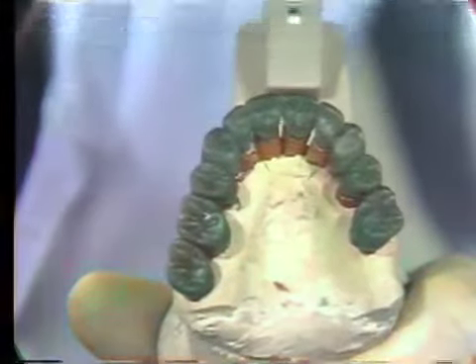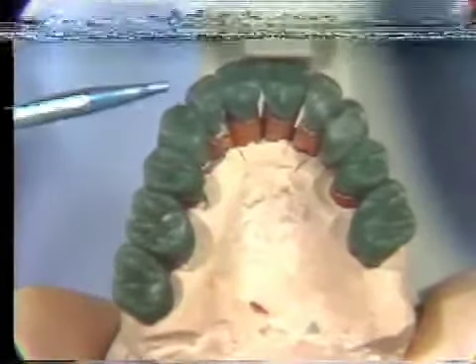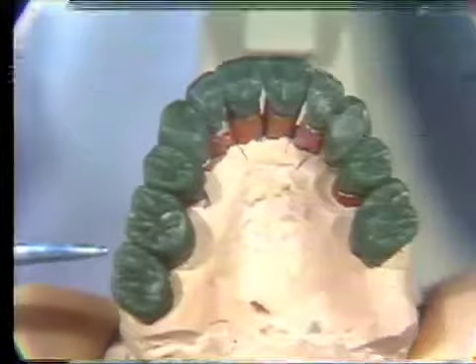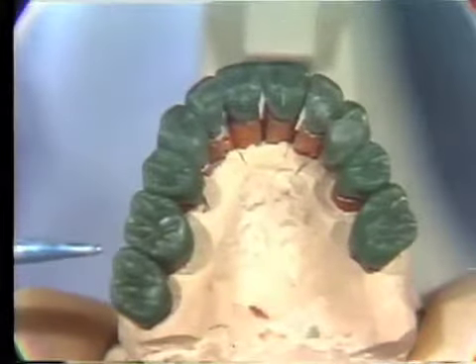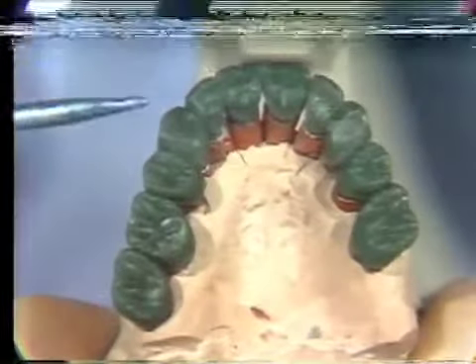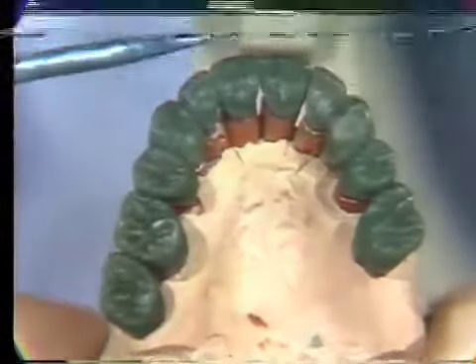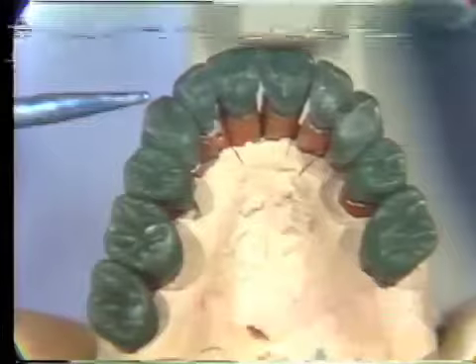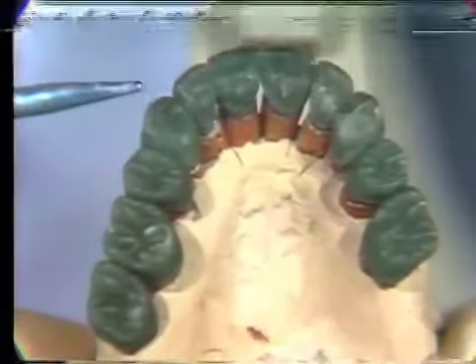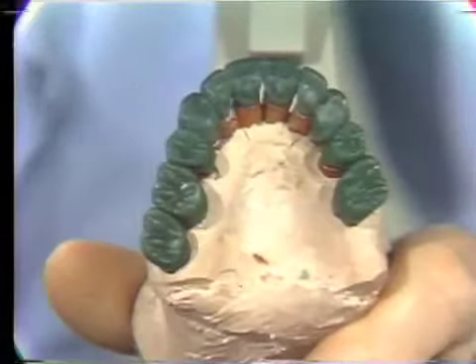Now, we have a full wax up at this time because we don't know how to design the anterior guidance until we put the teeth in wax. So we get a full wax up to begin with. And at this stage of the game, we'll go ahead and refine the anterior wax up, our guidance and our contact. We'll send this back to the lab and get the anterior teeth cast and on the anterior teeth, establish the guidance we're going to have for the case before we go ahead and refine the posterior teeth.